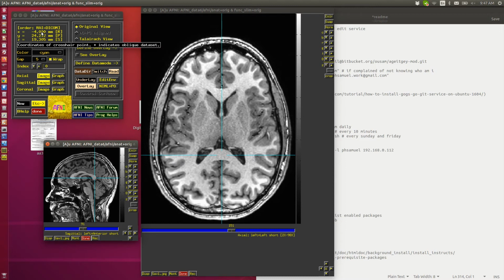But in typical neuroimaging literature, people don't use DICOM coordinates. They use what they sometimes call, cleverly, neurological coordinates, which is of course a meaningless phrase, but that field was full of meaningless phrases. You can set that here, so that is this order, the second order.